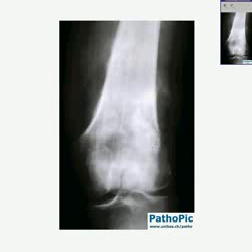What do we have here? Well, I think you will agree that it is a nice x-ray of the knee area. You could recognize this as the distal femur, and you could identify this as the proximal tibia with your medial and lateral tibial plateaus. But another thing that you can realize is the fact that there is destruction of this bone in a very irregular fashion.